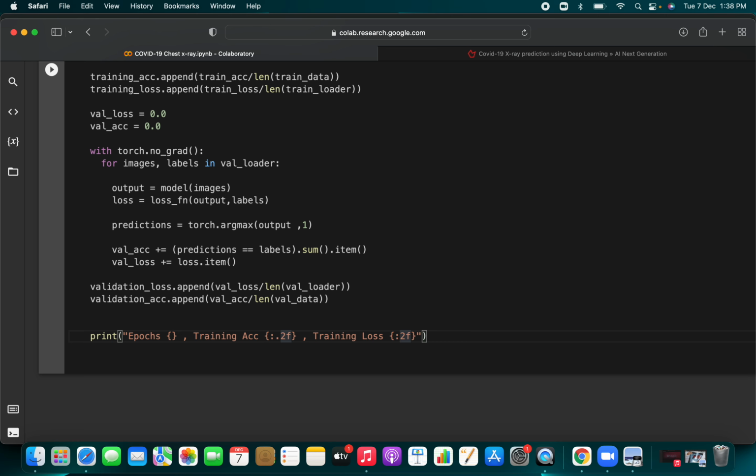And similar way you can do for the validation accuracy, with 0.2f, and similar way we have to do for the validation loss. You write the placeholder for that, and 0.2f. Clear with this? Now you write format. This is the way we are going to write.